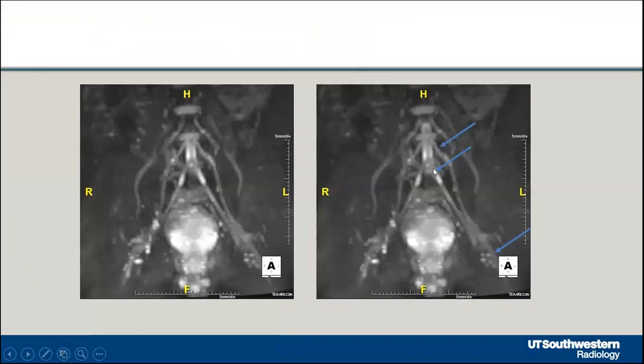But on DWI, you will see on the zero gap images, you'll see this abnormal preganglionic segment where they nick the nerve most commonly during discectomy.